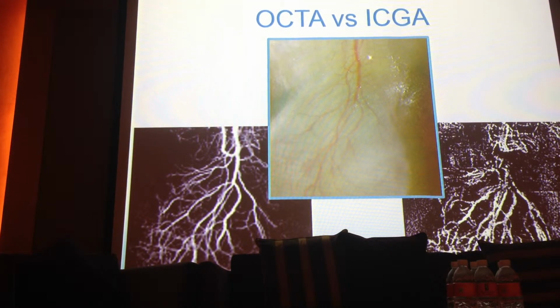I think 3x3 is more sensitive to the micro movement. Oh, I did this. Micro movements. Okay, so these are the micro artifacts. And I did this. This is like my best quality image. I did it again and again because I thought, can't be, right? I can't publish this.